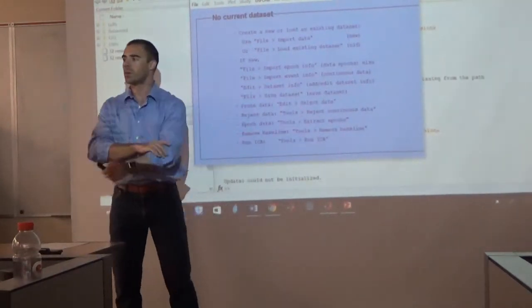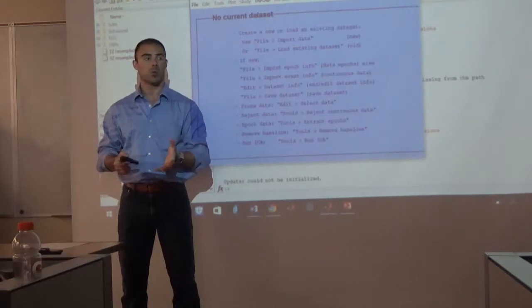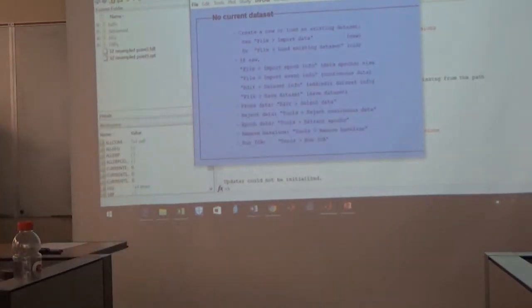Now, does anybody not have this? Okay, but wait. Is that not working for you, Bobby? Well, yeah. My path isn't set right. It's not right, because hers looks like this too. Okay. So what we do, you want to set the path right now.